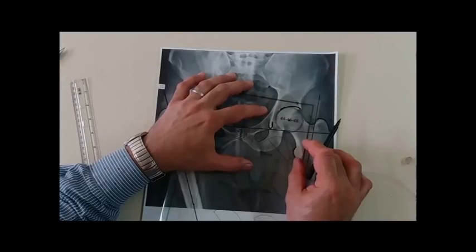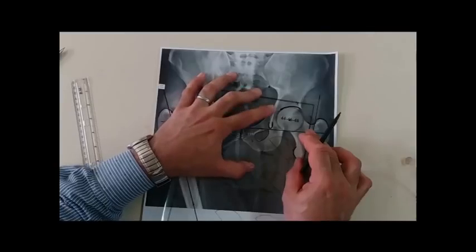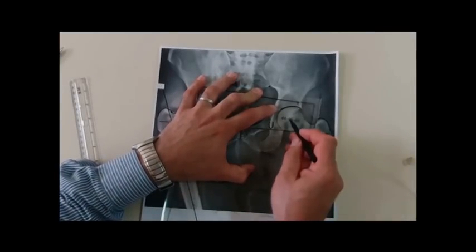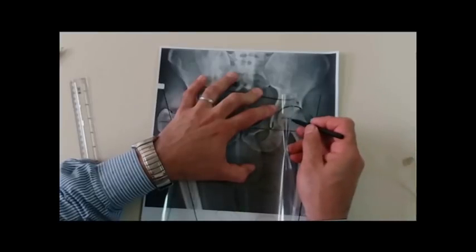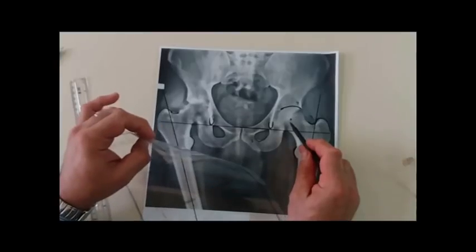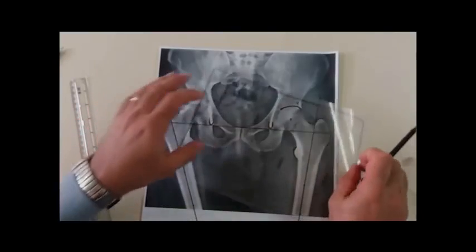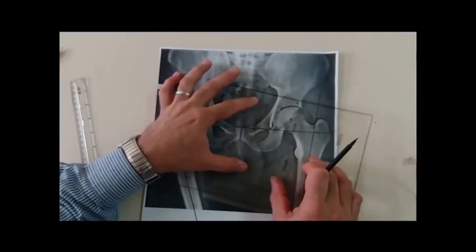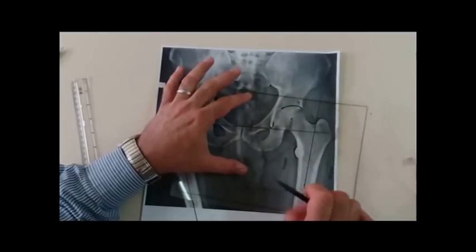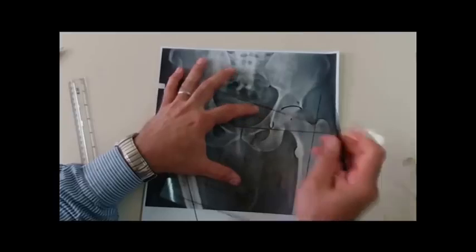For example, this 44 is not adequate. This 46 is adequate. I can define the center of rotation by superimposing this point onto the X-ray. This is the center of rotation for the head of the hip. It is the center of the acetabulum. I can further double check by superimposing these templates for the acetabulum, in different sizes. My guide is the normal acetabular floor.